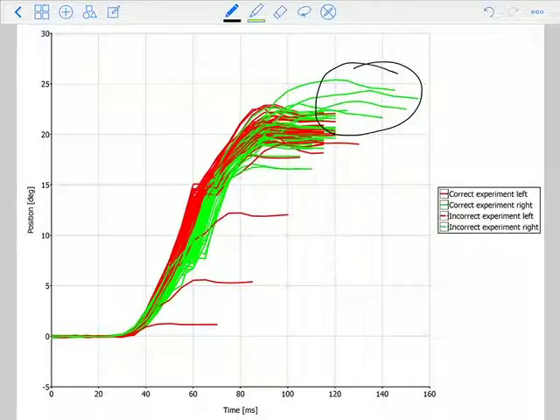But one thing I noted, and you can't see it really clearly on this graph, but I'll show you a sample individual trial, is that she has picked up these intrusions or hitches right between 5 and 10 degrees on right saccades, and you could see it probably more clearly on the left saccades, right before 15 degrees.